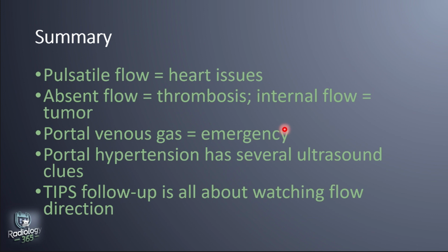To wrap it up, pulsatile flow usually means a heart issue. No flow in the portal vein could mean a clot, and internal flow in that clot means tumor. Gas in the portal vein is an emergency. And finally, portal hypertension and TIPS each have their own set of flow patterns to watch.